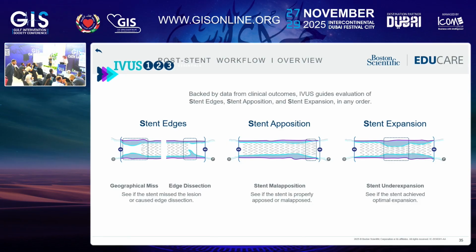The other important information: you want to see the stent attached to the wall or the plaque in that area, which is apposition. And more importantly, you want to see that the stent is expanded. That's when we're going to spend time on expansion, because this is an area where, for example, OCT immediately gives you a reference number. Same thing, it calculates the number based on the distal reference, and you could follow it easily, which we're going to discuss when we come to the post-PCI platform.